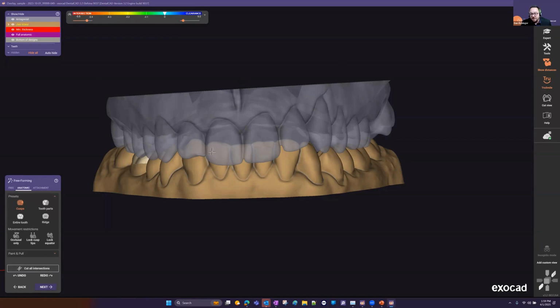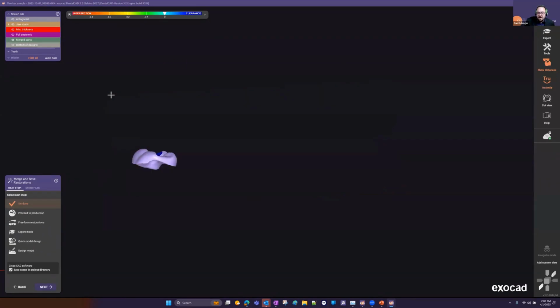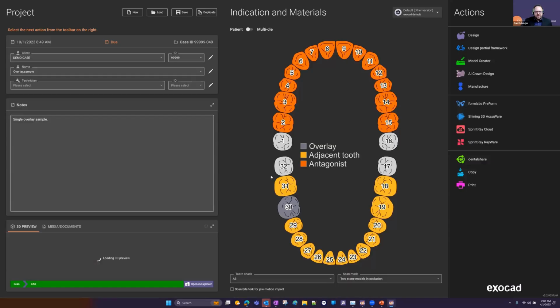If you need to recalculate your crown bottoms, you just go to that in wizard mode. So I'm gonna go ahead and select I'm done. Notice we're getting close to time here, but speaking of Exoprint, on our status bar, we see we're green on CAD. I have a finished design.